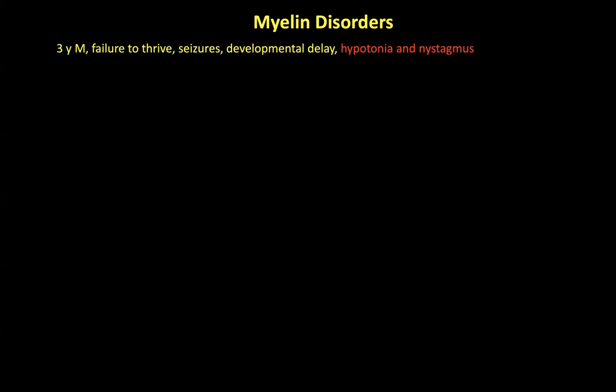And the myelin appears T2 hypointense and T1 hyperintense. Then, when the child grows, on T1 the white matter of the brain becomes more and more hyperintense, and the myelination on T1 is radiologically completed at 1 year of age. On T2, the myelination shows hypointensity of the white matter, so the white matter becomes more hypointense over time.